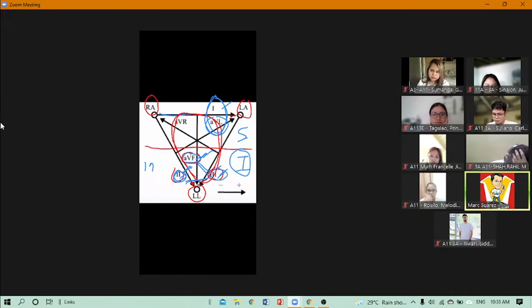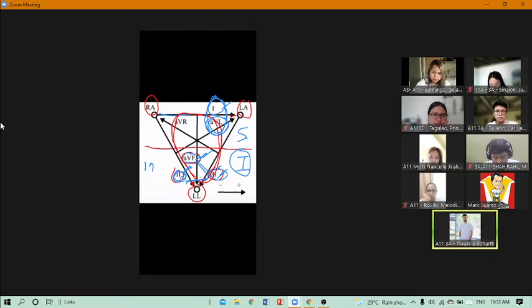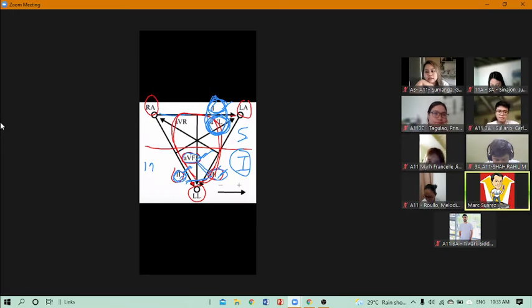When do we say again that it is significant? The ST elevation or the ST depression must be present in both of the contiguous leads. Yes, contiguous leads, meaning they are adjacent to each other, right? Yes, Doc. Okay, shall we proceed? Is it clear, or are there any questions before we move along?